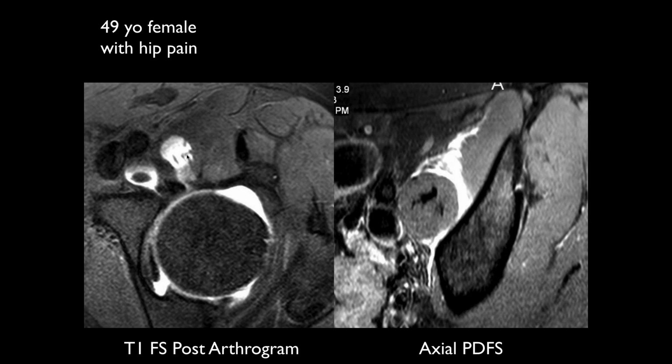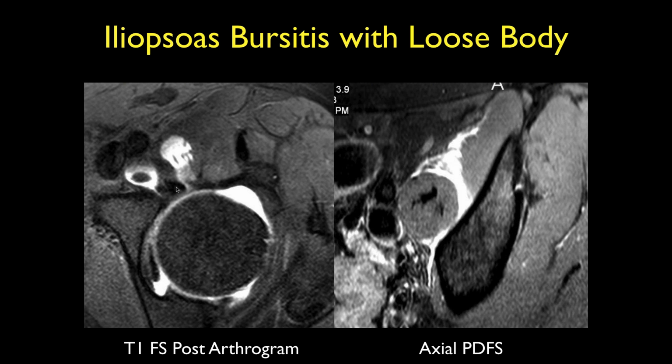So what we're seeing now, okay, so this is the hip joint, right? Right. So this is the femoral head. This is anterior. These are the femoral vessels, and now we've got a fluid collection here. Adjacent to them, next to this is a tendon that's coming down. Oh, this is the iliotibial. I'm sorry, not iliotibial.